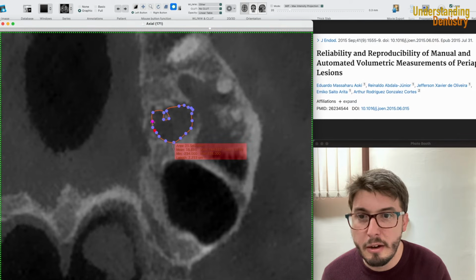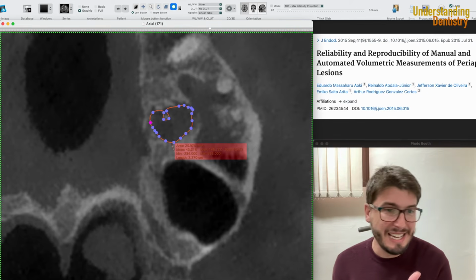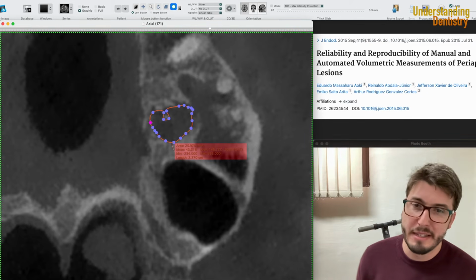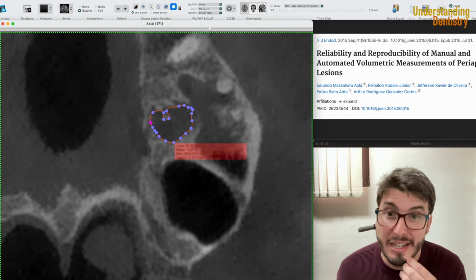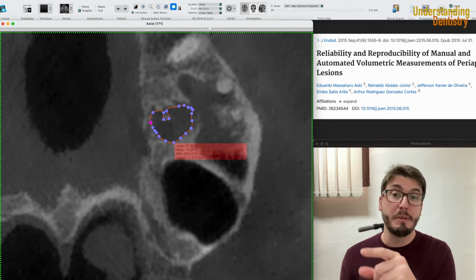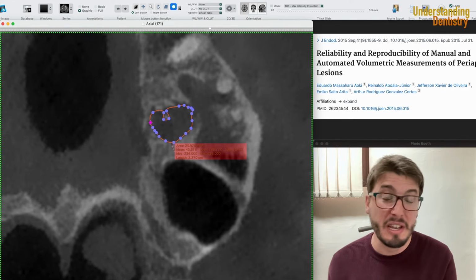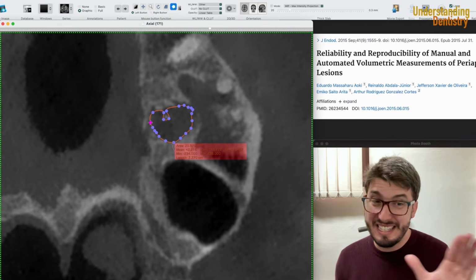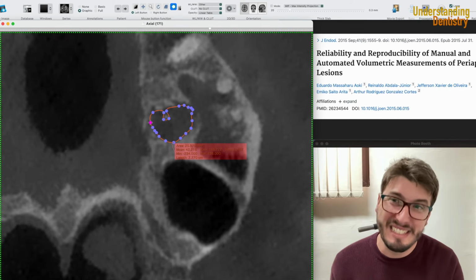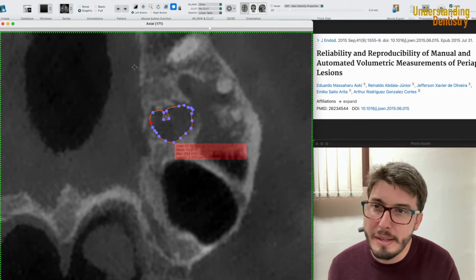All right. Of course, you guys should be asking, maybe AI will be available. Well, AI is available to do that already, but the algorithm of the software changes a lot, you know. Now it's challenging for this case because the opacification of the sinus has similar densities of pixels. So maybe it will include the entire sinus opacified area at the same time, you know. So here it's actually a challenging case to do that with AI. But you can always do it the manual way.